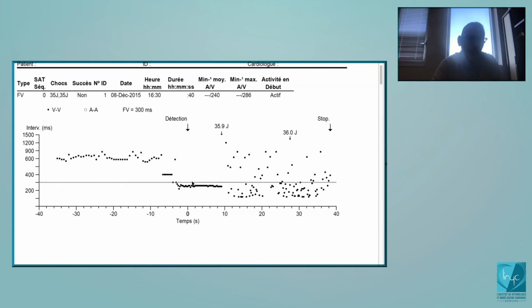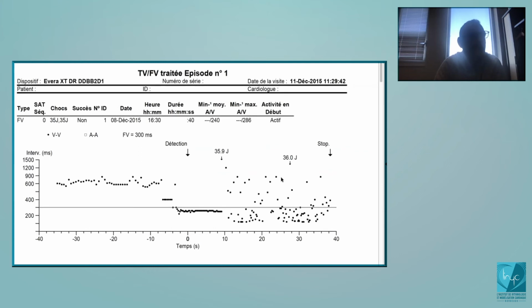I take quite some time for every tracing to have a look at the plot, always to start with the analysis, because here you can have the diagnosis. This is probably an arrhythmia, and this looks very unlikely to be physiological. Okay, go ahead.